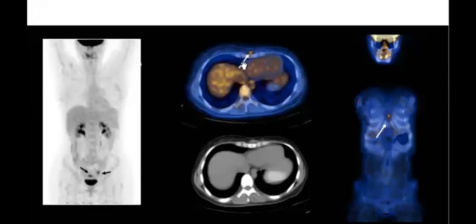Internal mammary lymph node, likely recurrence. But the internal mammary is maybe here, right? It should be in the typical location, here, just beside the internal mammary artery. So if you mention that it is subcutaneous, maybe that's more likely, yes, high uptake. So maybe chest wall, or you can mention subcutaneous, right?